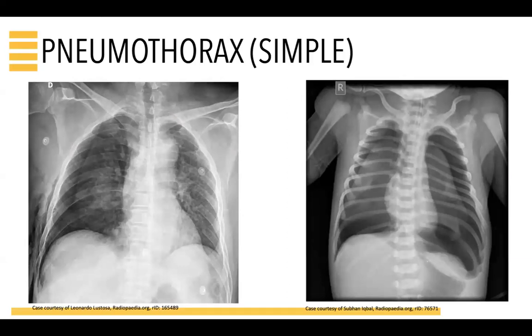The chest X-ray on the left is of a multi-trauma vehicle accident patient. Notice the obvious pleural border where no pulmonary vasculature is evident beyond this point. There is no mediastinal shift. Also note the presence of subcutaneous air on the right chest wall.